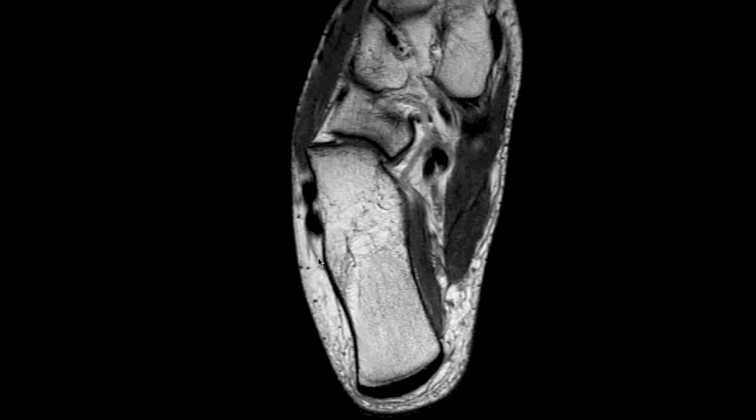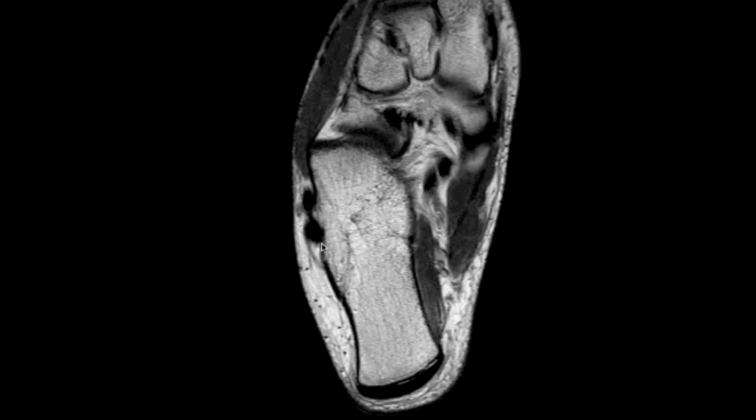At the level of the body of the calcaneus, we see the inferior peroneal retinaculum that helps to stabilize the tendons at this location. We also have two very important bony landmarks. The first lies posterior to the peroneus longus, and that is the retrotrochlear eminence. We also have a second bony protuberance that lies between the peroneus longus and brevis, and that's the peroneal tubercle. The peroneal tubercle will demarcate where the common peroneal tendon sheath will split into the sheath for the peroneus brevis and the sheath for the peroneus longus. If it becomes hypertrophied or enlarged, the peroneal tubercle can lead to peroneal tendon dysfunction.